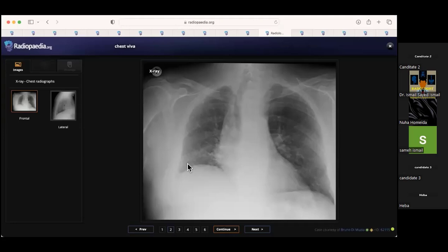And I'm going to check. The heart is unremarkable. I'm checking the bones. Nothing in the bones, so the bones are fine. Given this appearance, and at old age, I'm considering, I'm suspicious of something at the hilum.